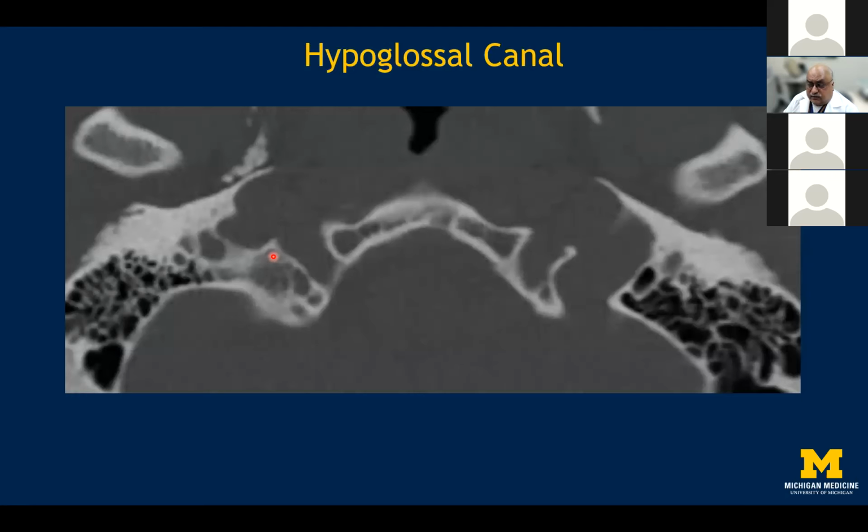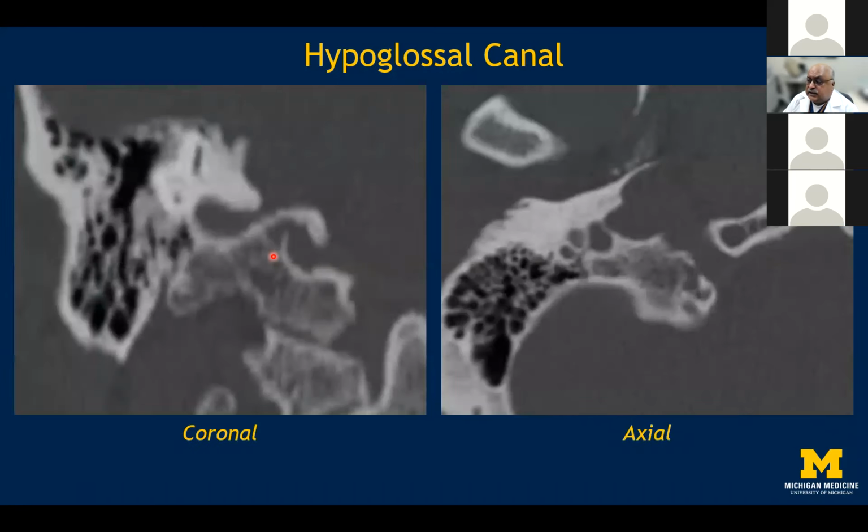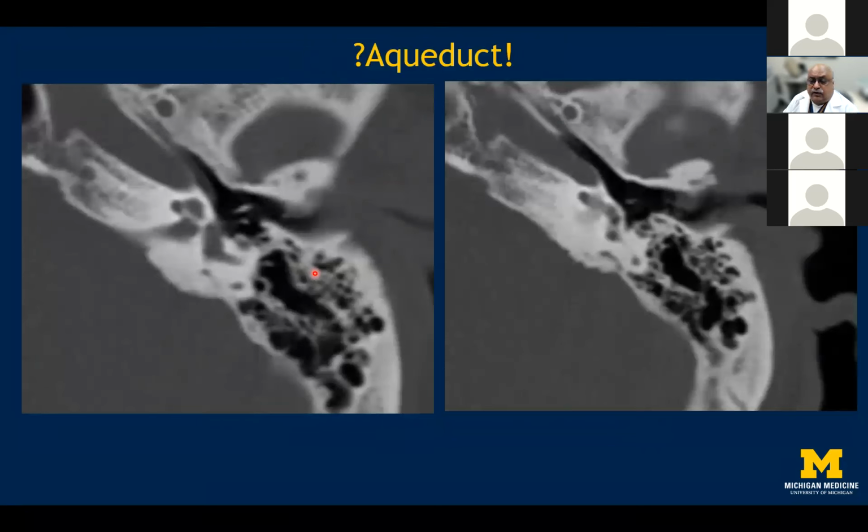The hypoglossal canal is a fairly wide channel which occurs at the edge of the clivus. One can see the hook-like structure of the jugular spine, which bounds the canal here. The hypoglossal nerve is one of the components which we can see in cases of perineural metastatic involvement, and also in other meningeal pathologies like extensive neurosarcoidosis, where the perineurium enhances.